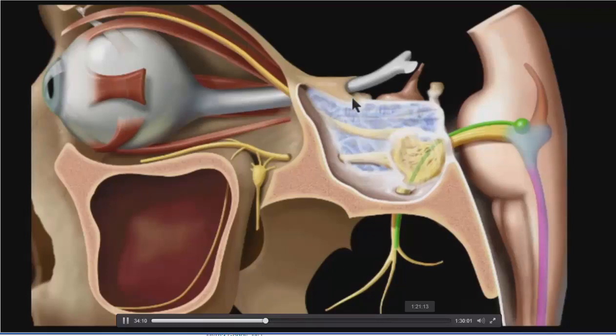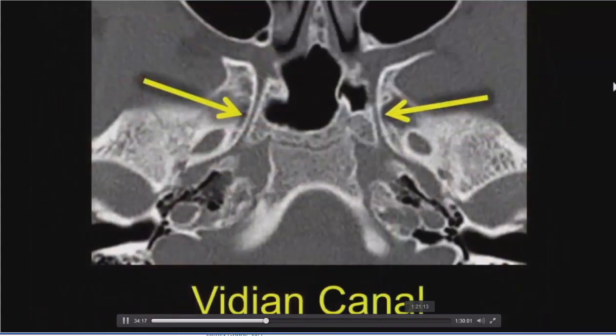So we can remember that anatomy as it goes through, and this is a big part of the central skull base, especially as you heard when we were talking about perineural tumor spread. So here's that thin curvilinear Vidian canal coming out, going forward to the pterygopalatine fossa, and that's an important way station for us in the deep face, especially with perineural tumor spread.